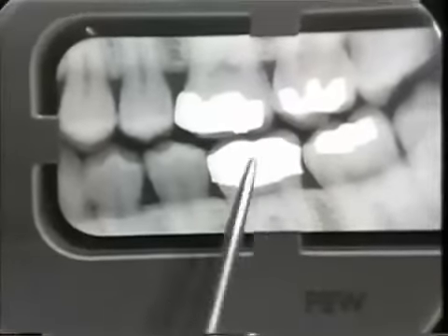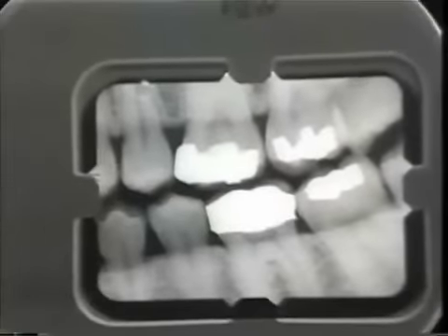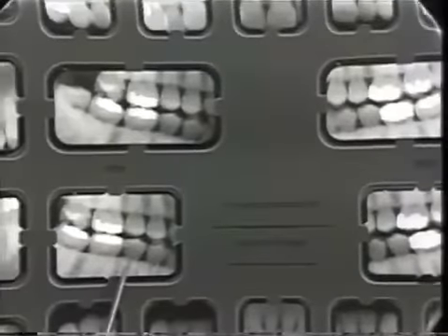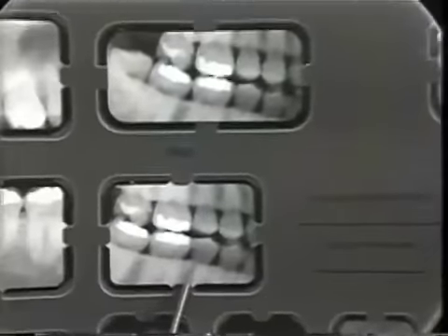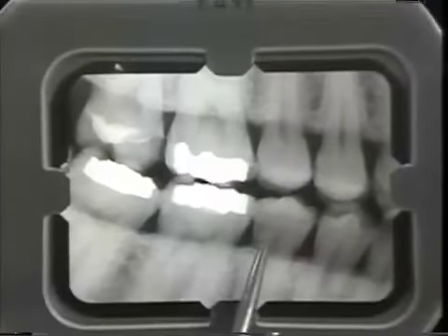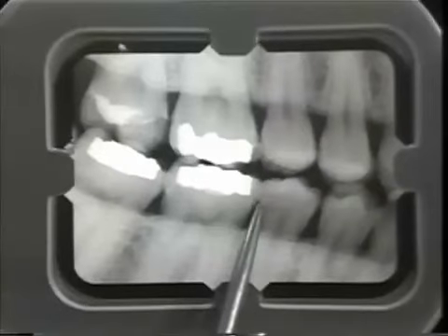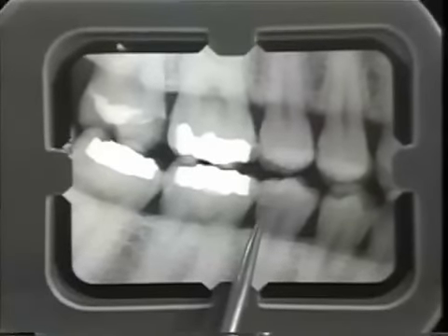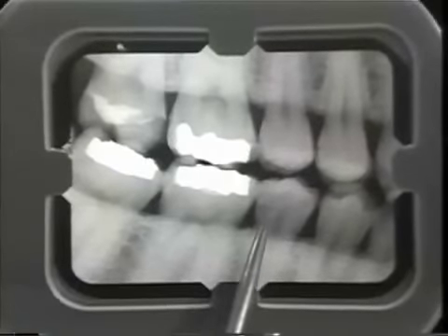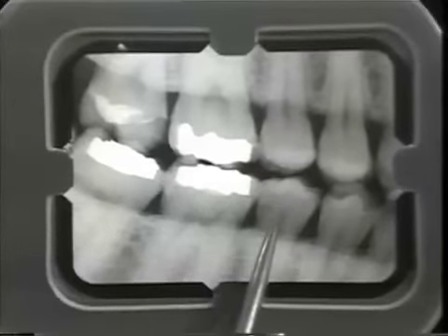All these can be verified with the additional film, which is located here. If we continue with 28, it looks normal. 29 shows a radiolucent area here in the distal of number 29. And this is not located in the normal position for an interproximal carious lesion. It is slightly lower. And I suspect that it is a cervical caries, either buccal, interproximal, or lingual.